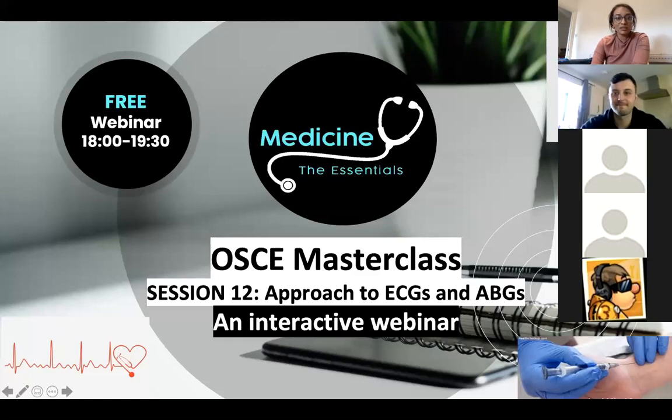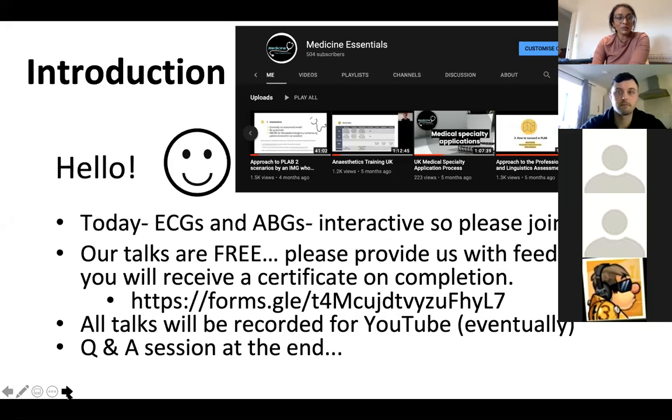So today we'll be going through an approach to interpreting ECGs, as well as a bit of interactive. It'll be very interactive, and I'll be asking you a lot of questions about ECG interpretation. And then I'll hand over to Logan, who will go through an approach to interpreting arterial blood gases.